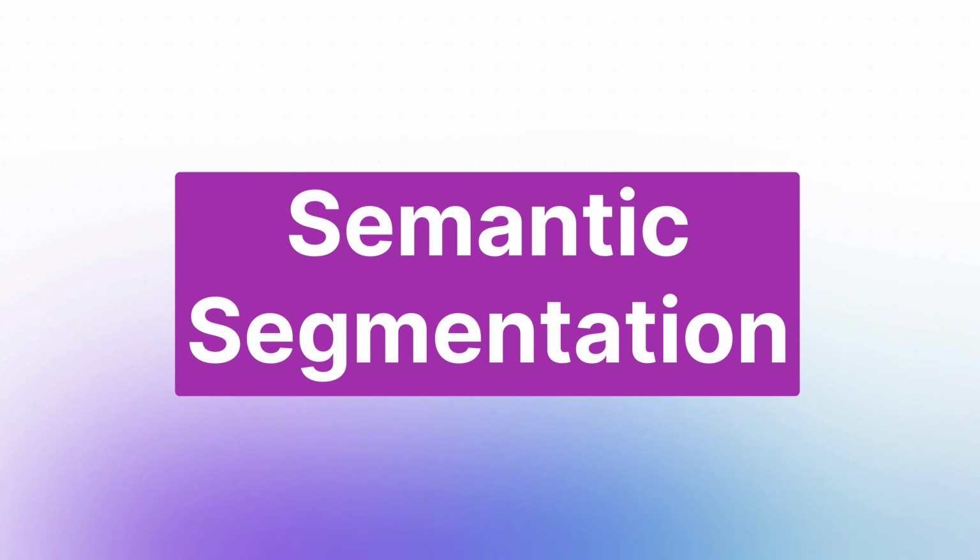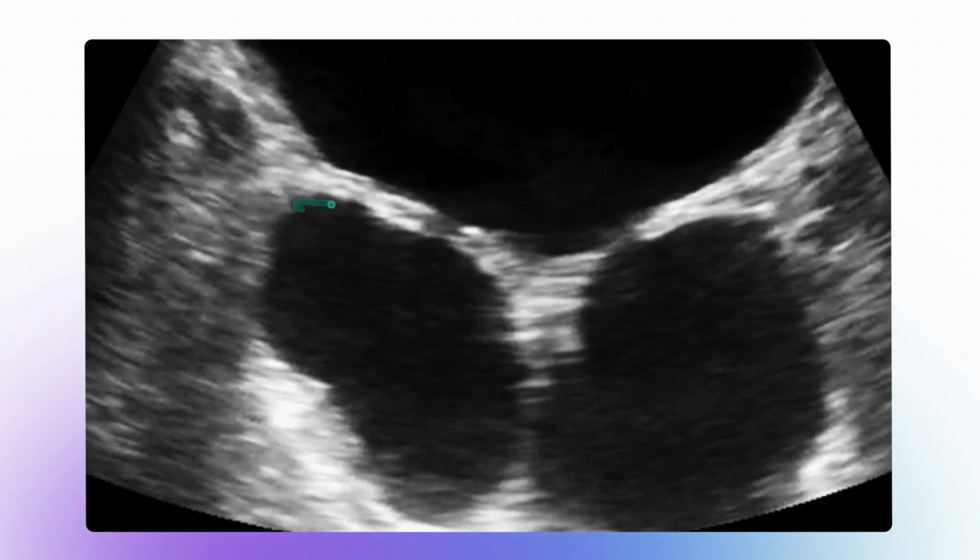Masks in V7 allow you to create a pixel-perfect layer where you can categorize each pixel to a specific class. Let's begin with the advantages of incorporating semantic masks into your annotation workflow. First, masks are especially useful for semantic segmentation. You can use masks to categorize different areas within images, providing valuable context for your models. This is especially helpful when objects have complex boundaries or pixels should only have a single identity.